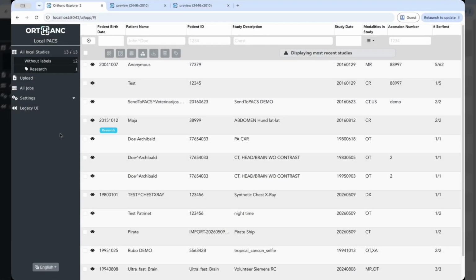Okay, and now the very last part, the only thing that's left, is this section right here, the sidebar that we need to look at, because there's a few very important functions available in here as well.